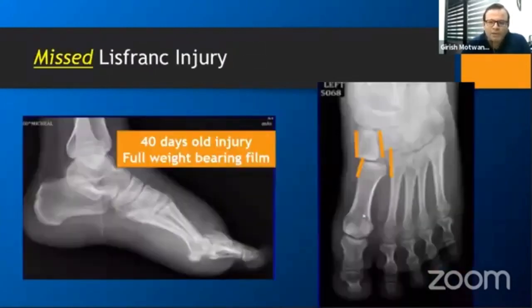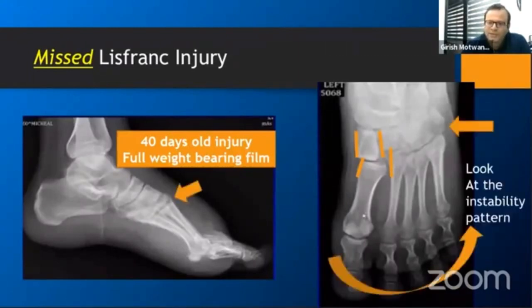And also look at the cortices here. We have discussed that if you lose these cortices, middle cuneiform, you will get a clear-cut mode of injury. Look at here, this is a hyperabduction injury. Also, you have a cuboid fracture in the same patient. So now you can understand what the pathology is. It's a hyperabduction injury. So the whole of the metatarsals, first, second, third, fourth, are all disturbed in the hyperabduction, and it has created this grievous injury.